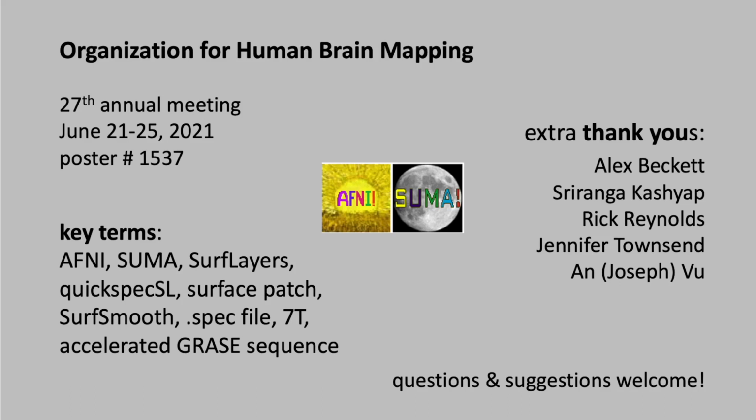AFNI's always tried to help users stay close to their data. We hope these tools enable a unique ability to explore cortical layers and depth-dependent activation across the brain.